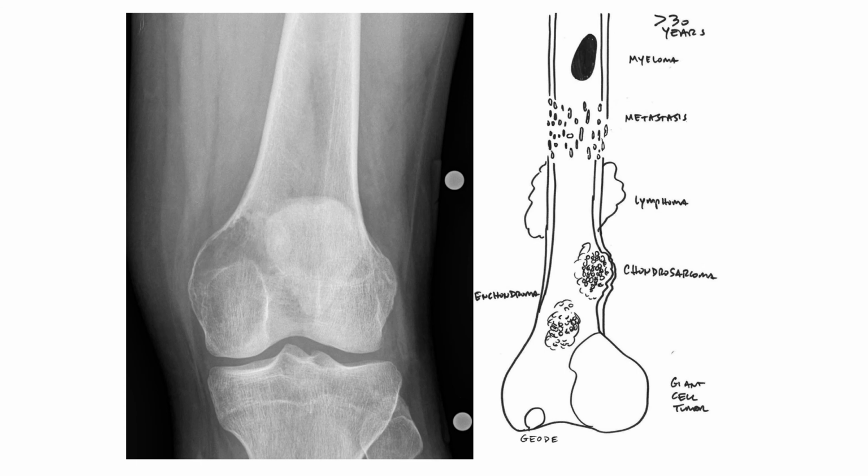Here's a giant cell tumor of bone. It's on the medial metaphyseal portion of the distal femur. There's a very narrow zone of transition as the lesion extends into the intramedullary space. The bone itself is having neo-corticalization and expansion, all consistent with giant cell tumor of bone.